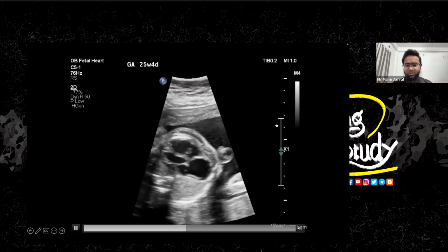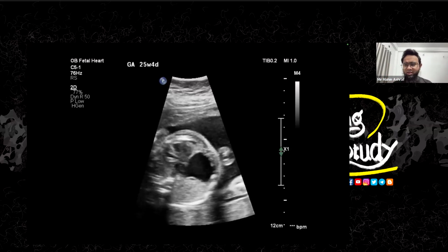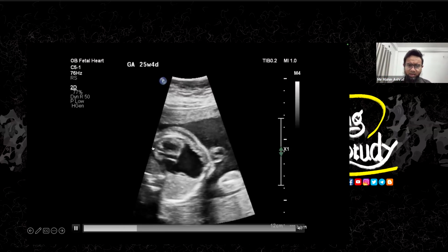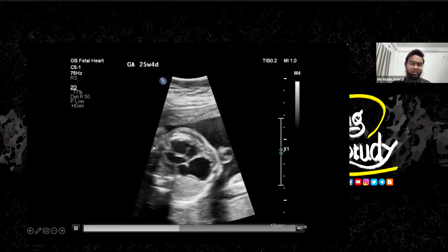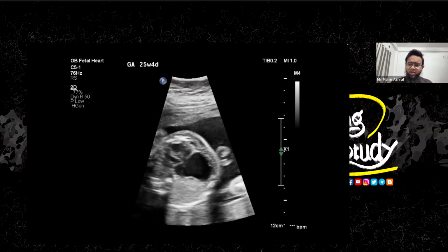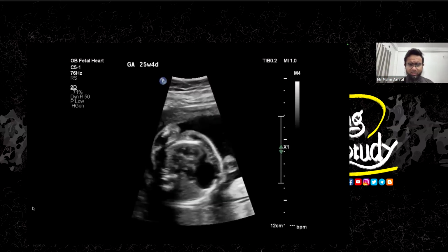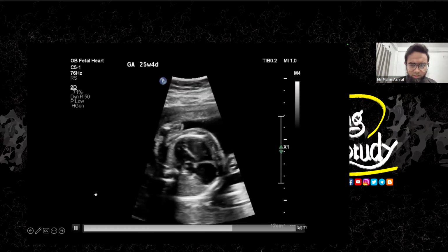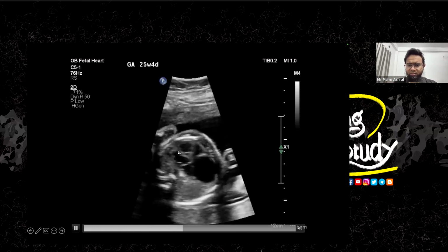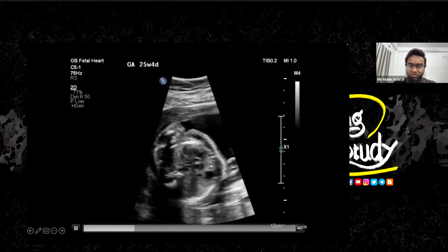Number two, you can see the right atrial enlargement. Number three, you can see where is the cardiac apex. The apex should lie at this part, but the apex is deviated more towards the left because of right atrial enlargement. So we have already concluded the diagnosis, I know. Let's jump into another picture. Here you can see this image little adjusted, and there was no VSD or something like that, but you can see the right atrium is much enlarged.